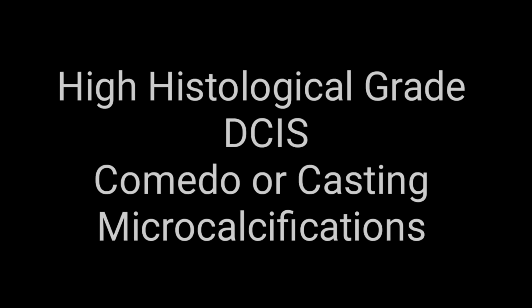Microcalcifications are more likely to be malignant if they are clustered, vary in size and shape, for which you can use the word pleomorphic, or are found in a ductal or linear distribution. So think of malignant microcalcification.